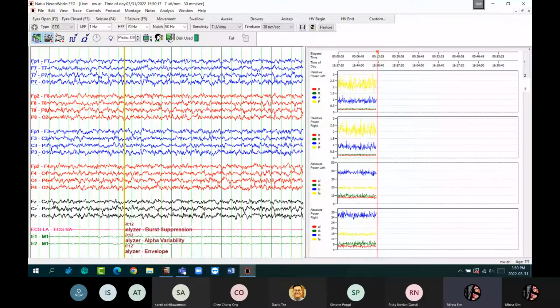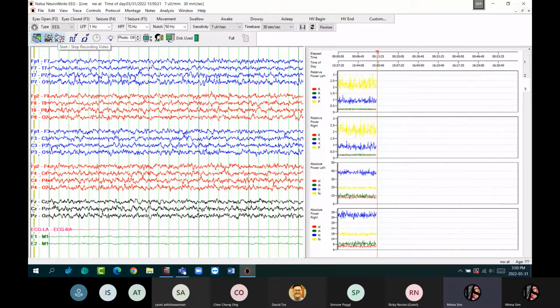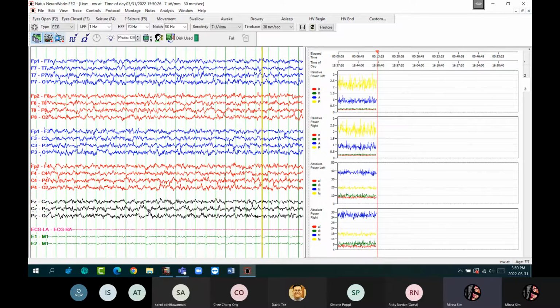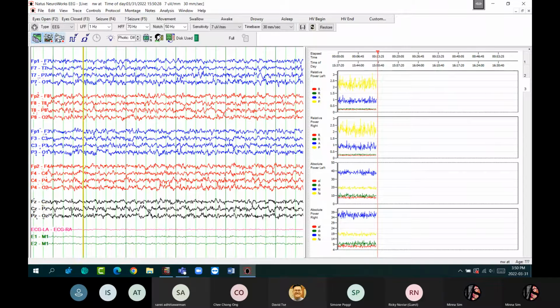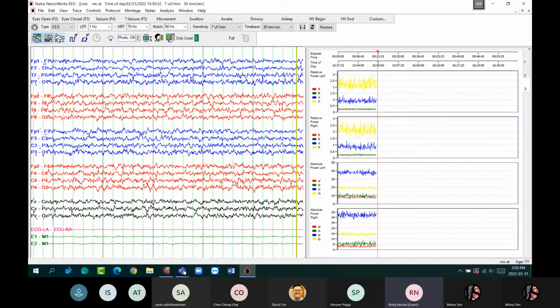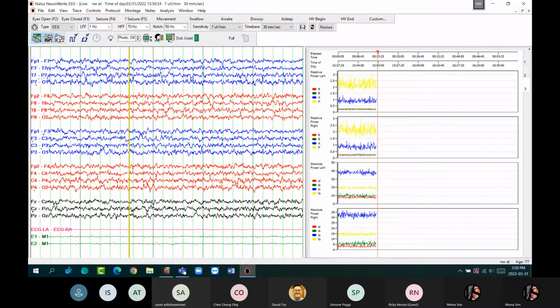Okay, next, before I move on to the next segment, are there any questions regarding these settings? Yes, Nina, I have one question about the profile.